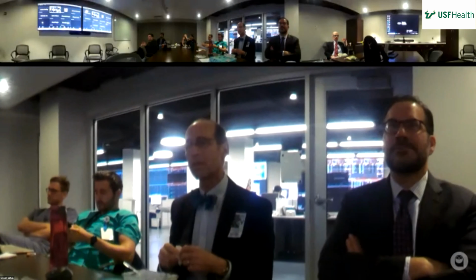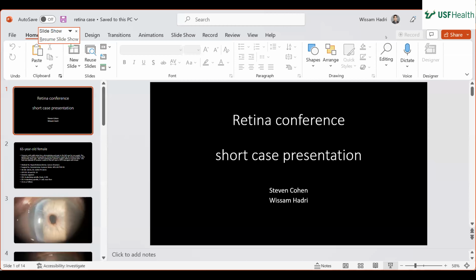So go back to the UBM. What do you think this patient had? People said subluxation, but I thought it was malposition. Yeah, it was malposition. It half the lens.